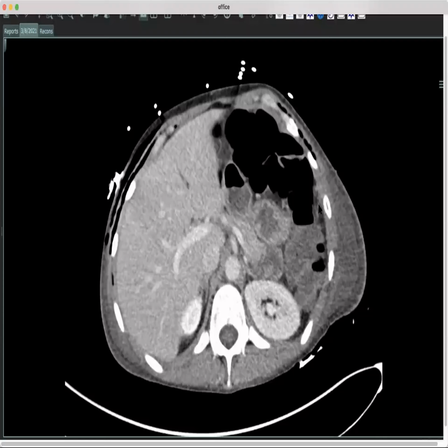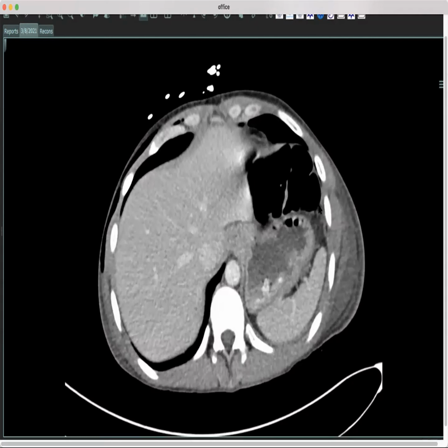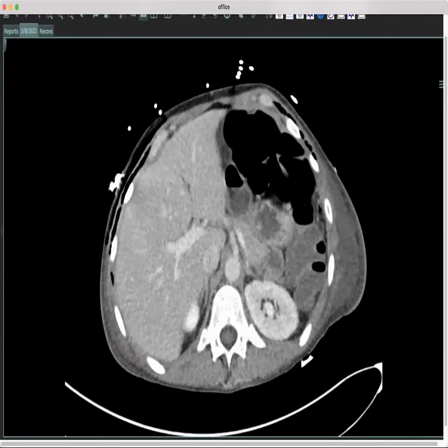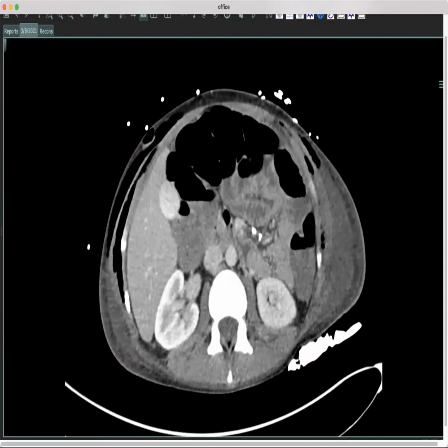Okay, hopefully you guys can see the CT. Yes. This is okay. So this person I got called about from one of our satellite hospitals was someone who had signs of infection and recently had surgery. And so I'll withhold the rest of the details just to see if anyone else can identify what might have happened here. But I'm happy to give more if we need to.